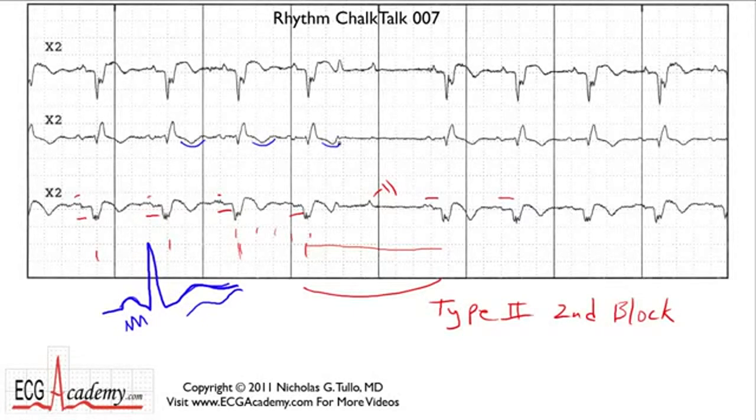Now, what's interesting is there's something kind of in the tail end of that T wave. And if you look at this lead, this T wave appears to have this particular shape. I don't know what you might call it, a biphasic shape. And then this T wave, the shape kind of changes a little bit. It kind of goes up a little at the end. Well, what is that? Well, this is the lead that shows it the best. This is a P wave. That's right. Maybe you didn't notice that before. Maybe you guys who are good at reading EKGs might have picked that out. But here's a P wave.